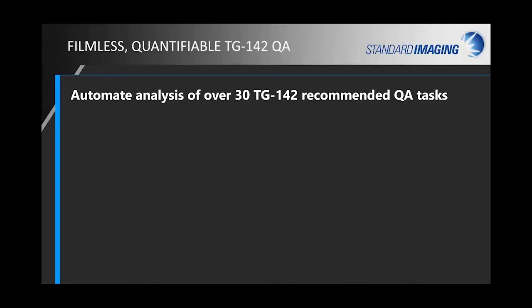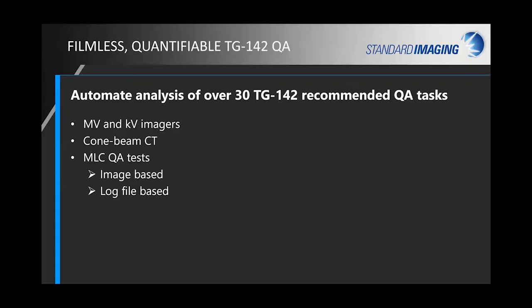But let's move along. I want to jump into what PIPSpro is. It's a software package that allows you to automate the analysis of over 30 TG142 recommended QA tasks, including your MV and kV imagers, your cone beam CT imaging, MLC QA tests, both image-based and log file-based, and I'll touch on those as well.